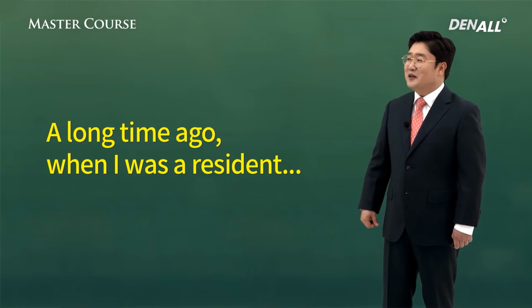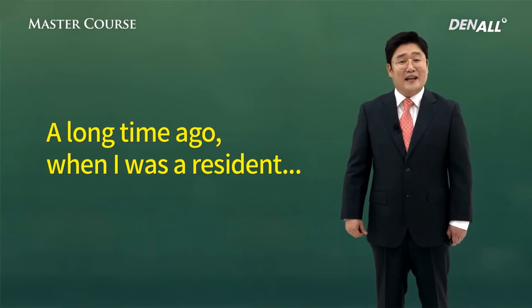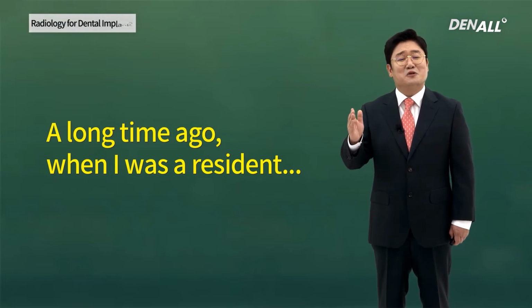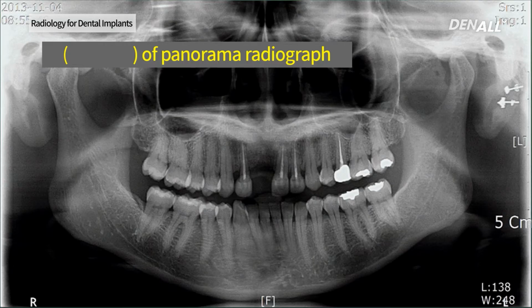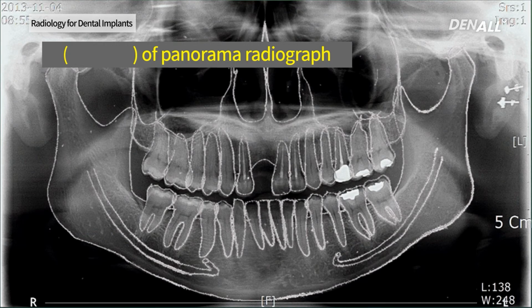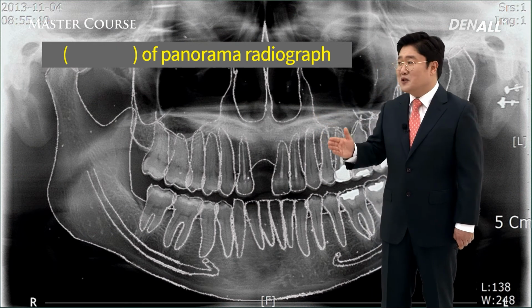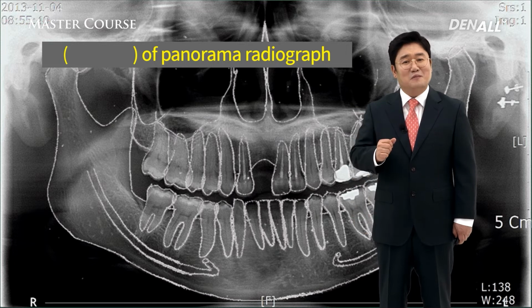A long time ago, when I was a resident in oral maxillosurgery department, I had to do things with the panorama picture. Over the panorama, transparent paper was laid. Teeth and important anatomic structures were indicated and their relationship was identified. What was that?